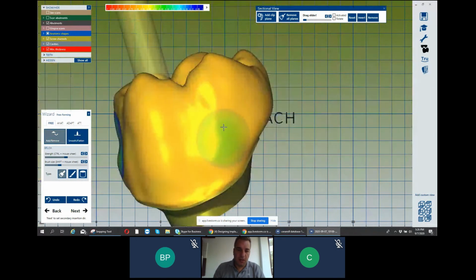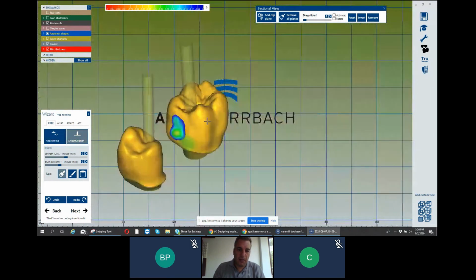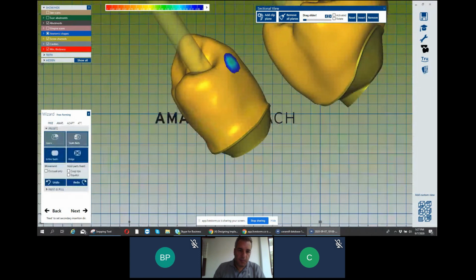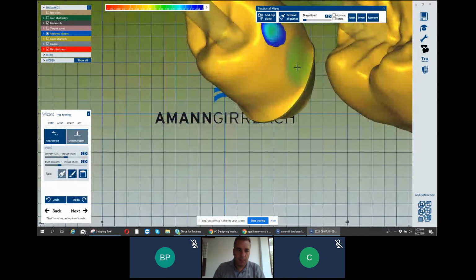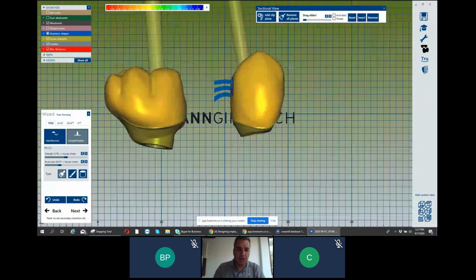I won't take time with the design, but just like this, a little bit. You see, I did the design of the restorations.